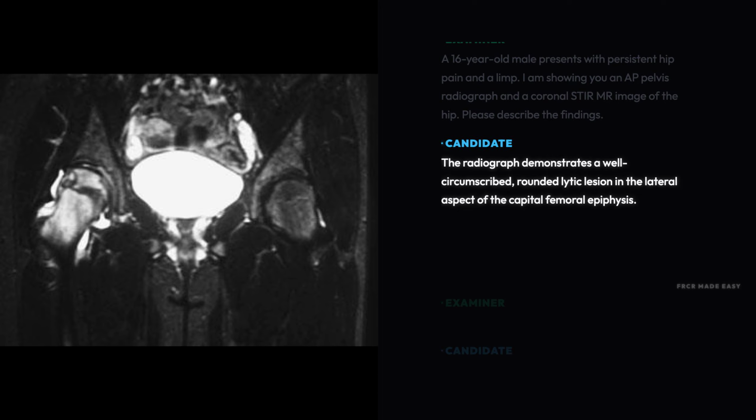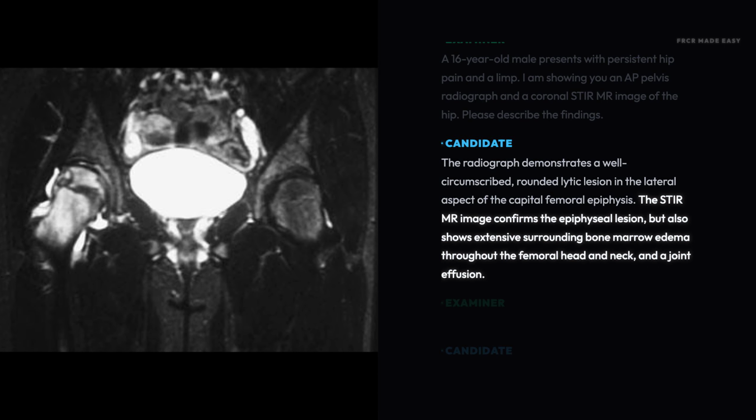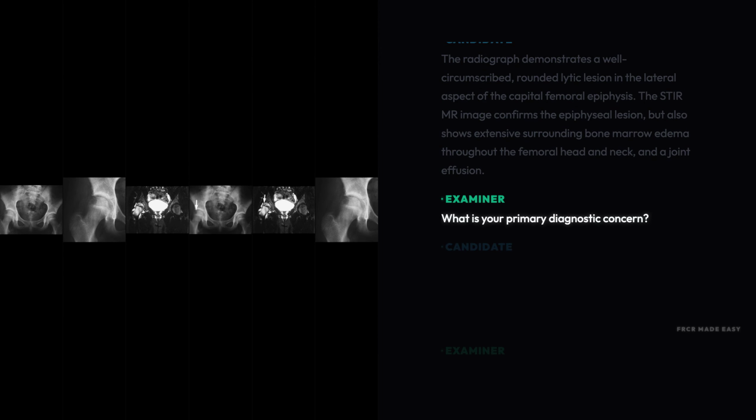epiphysis. The STIR magnetic resonance image confirms the epiphyseal lesion, but also shows extensive surrounding bone marrow edema throughout the femoral head and neck, and a joint effusion. What is your primary diagnostic concern?